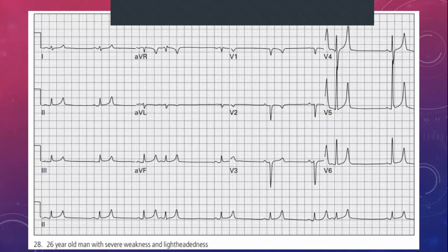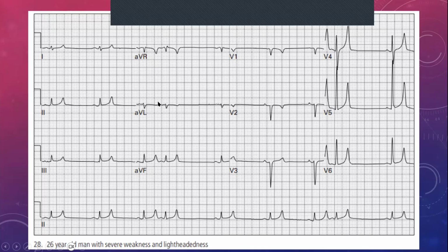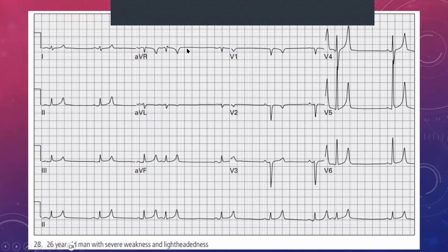Okay. So, sorry. So getting back to that, we'd expect to see some ST elevations or possibly something along those lines, but coming into these, we don't really see that. If we look at the high lateral leads, leads 1 and AVL, sorry, we don't see any ST elevations. And if we look at lead AVR, also, we don't really see any ST elevations per se. There's a thing that we call slurring going on over here, but that's something else completely.